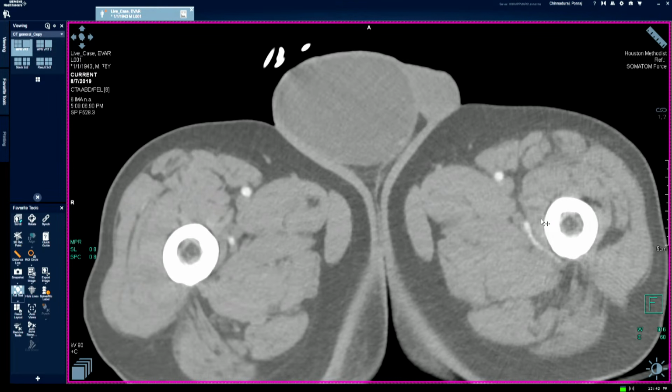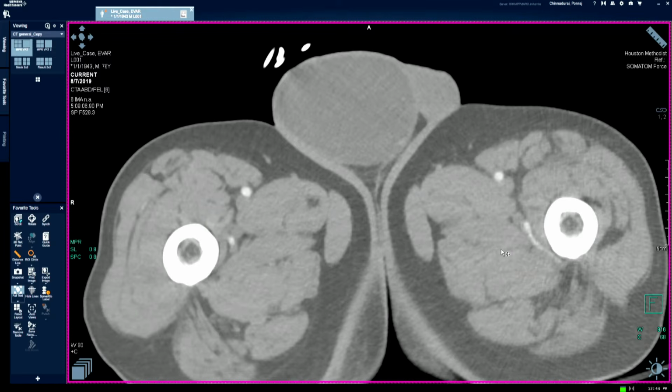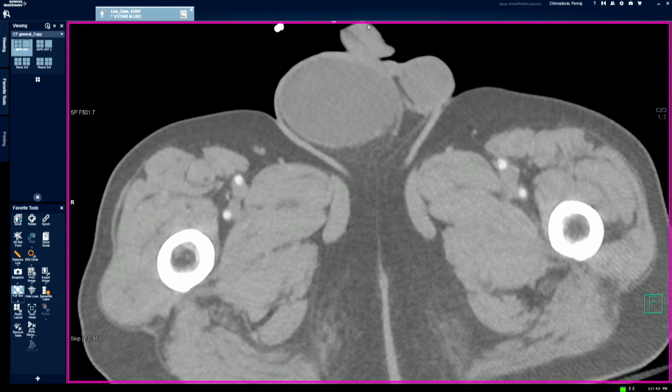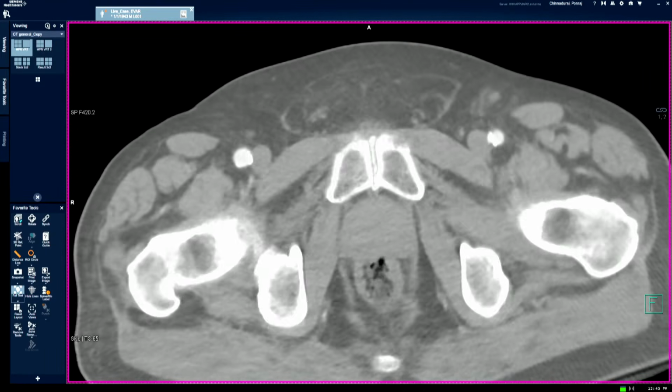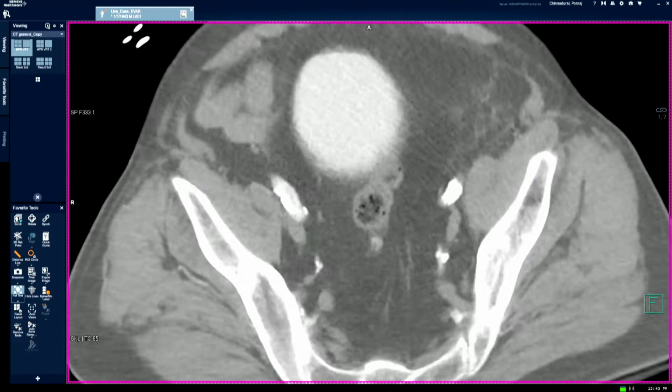I'm going to scroll through. Whoever wants to be a volunteer? Anyone? Yes. Choose a volunteer. Okay. I'm sorry, can I get your name? Dylan. Okay. So you can really pick on them pretty bad. I'm scrolling up, and you can tell me the access side and see which side you are going to go through. There is a reason why I'm doing this.